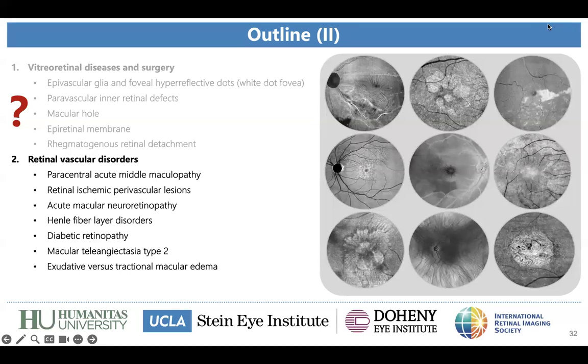Thanks so much for this question. I think this is the most important point, because segmentation is everything in en face OCT. Of course, based on the symptoms of the patient, we can choose the first and most important segmentation, usually very easily, since we are usually talking about chorioretinal diseases. So in AMD, I usually start by looking at the outer retina to see if there are alterations such as drusen or outer retinal alterations in general, including ellipsoid zone disruption.